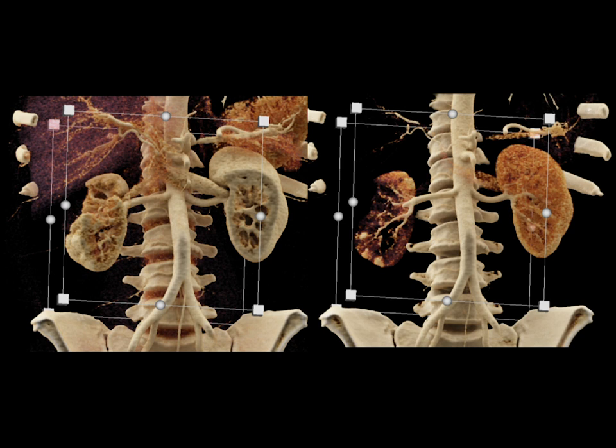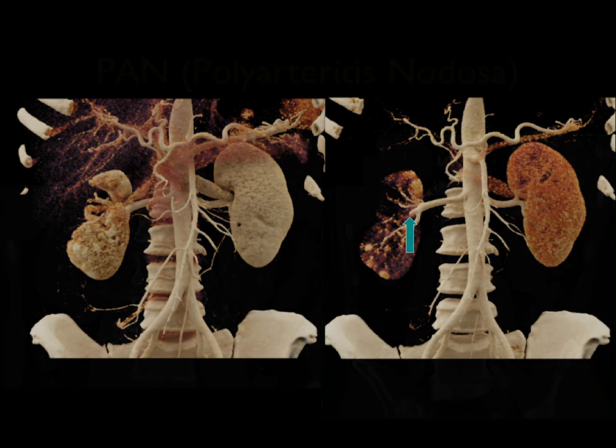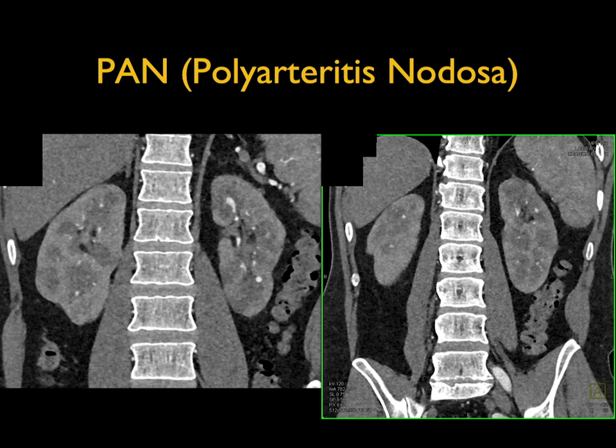The loss of cortex in the patient's kidney is accentuated, but again, we know that's the area of infarction, very nicely shown on these 3D images with cinematic rendering. Sometimes, you don't appreciate things.